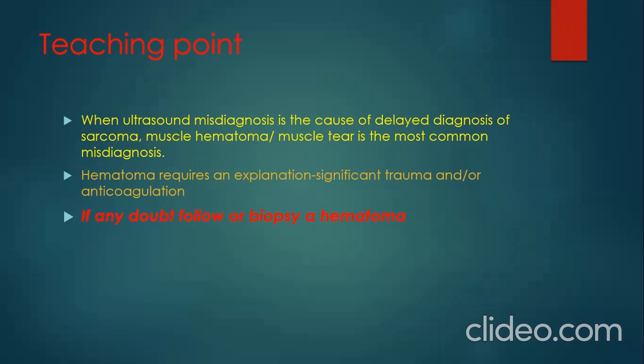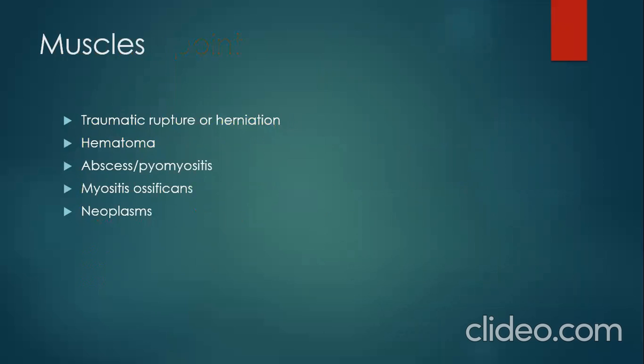With time, hematoma changes its appearance and its consistency, the physical consistency changes. Or rather just do a biopsy, especially if you follow it up and you don't see any changes, so that we don't miss these sarcomas and delay the treatment and diagnosis of these sarcomas.